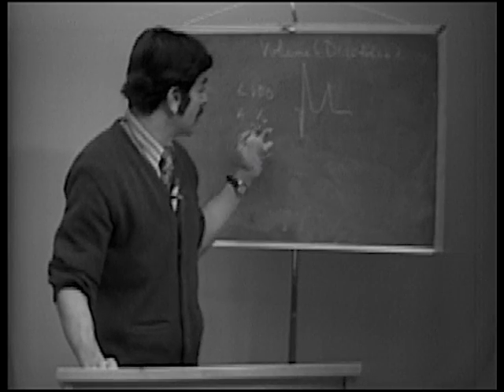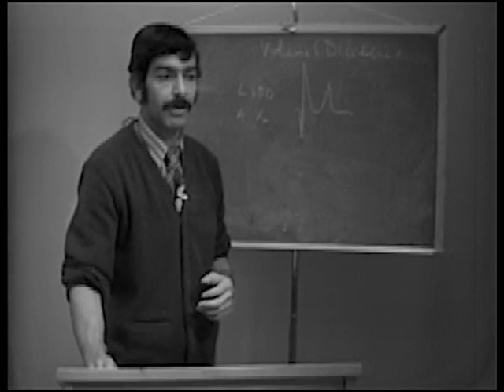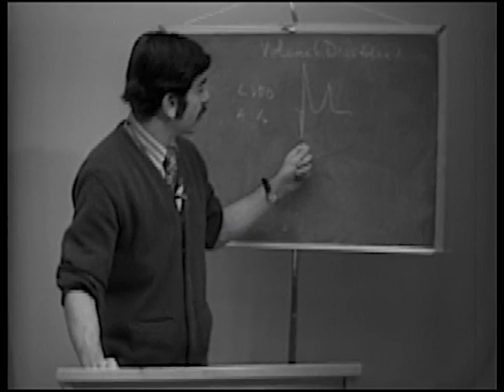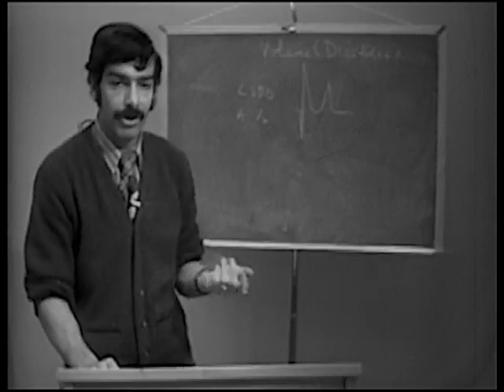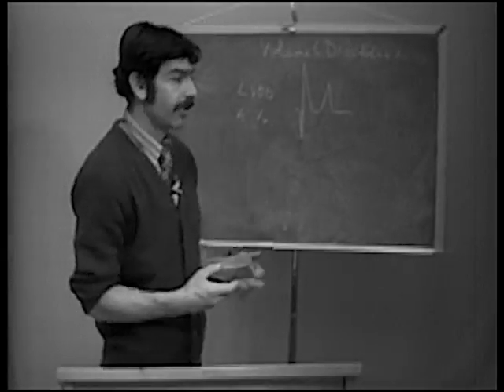And it's seen in the lateral leads and occasionally in the inferior leads, 2, 3, and AVF. So when you see a pattern like this, you should think of generally three things: diastolic overload of the left ventricle, lateral wall infarction as a possibility, and then the rare disease, idiopathic hypertrophic subaortic stenosis, IHSS.